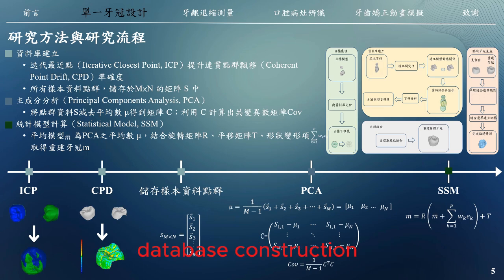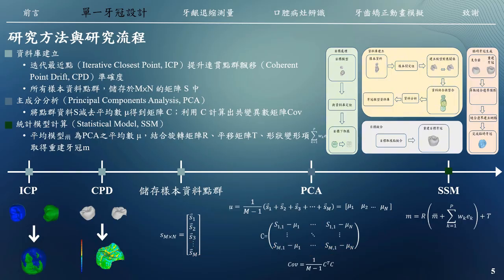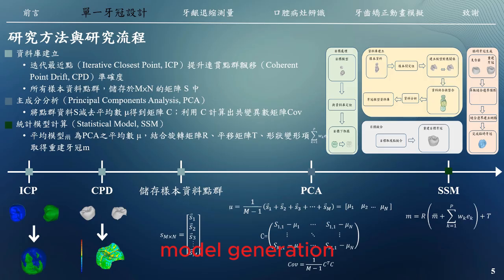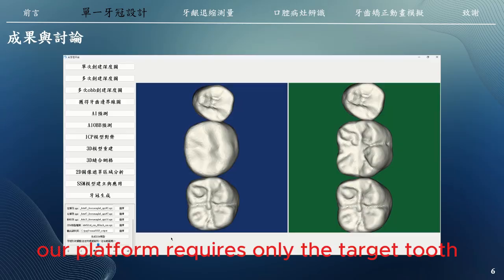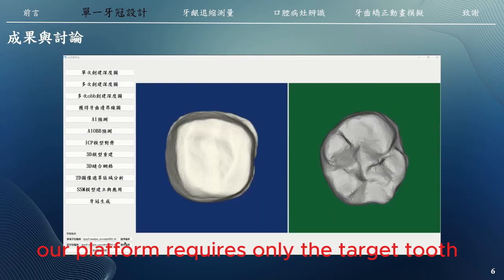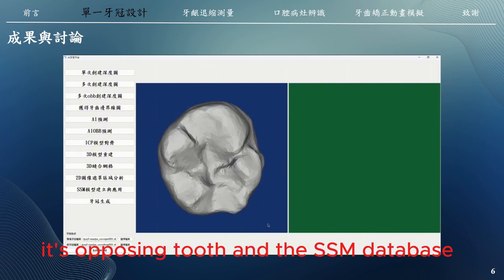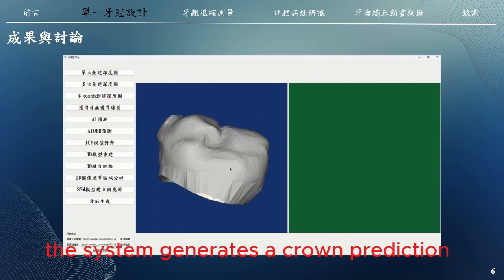Database construction. Import base crowns and samples, perform ICP plus CPD alignment. CPD ensures point-to-point correspondence. PCA modeling. Compute mean shape and principal modes of variation. Model generation. Use PCA weights to generate deformable crown models. Our platform requires only the target tooth, its opposing tooth, and the SSM database. Within 5 seconds, the system generates a crown prediction.